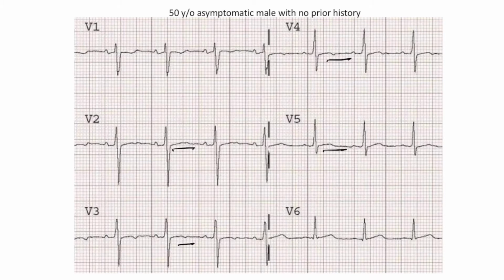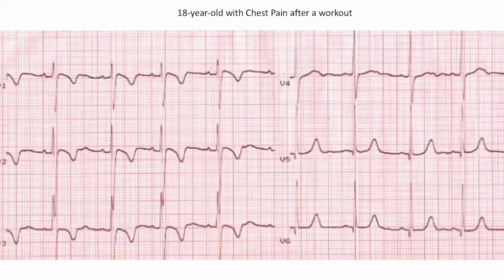For instance, if you saw the exact same EKG with a prior EKG that shows good T waves, and now the patient were coming in with chest pain, these could be coronary artery disease. So it's very important that you interpret an EKG in the clinical context. Next, get to the next EKG.